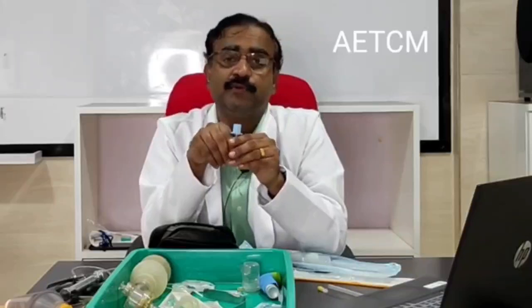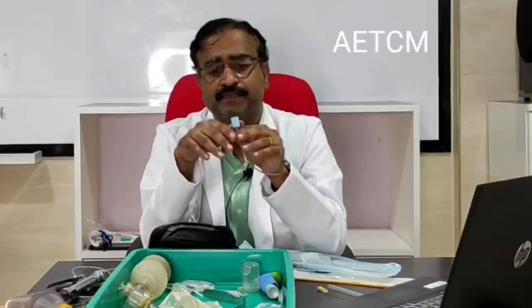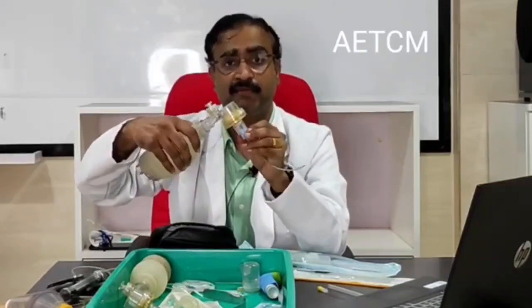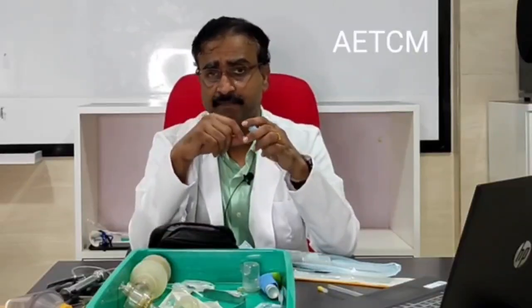Now, how do you know you are inside the vocal cord successfully? If there is a lot of debate among you and your colleague or assistant, saying that no, we are not in through the vocal cords, we are not in the trachea, instead we are in the esophagus, what would happen is you will find a lot of gastric secretions coming out. The moment you attach this to an ambu bag and you start bagging, or you give a lot of positive pressure ventilation, you will find that the abdomen gets distended. That itself is a very major indication that you are not on the right track.